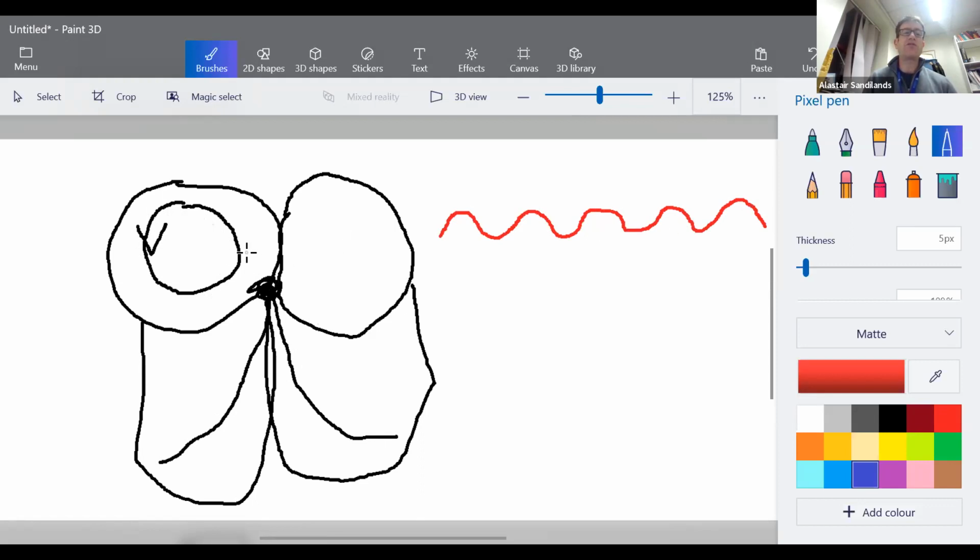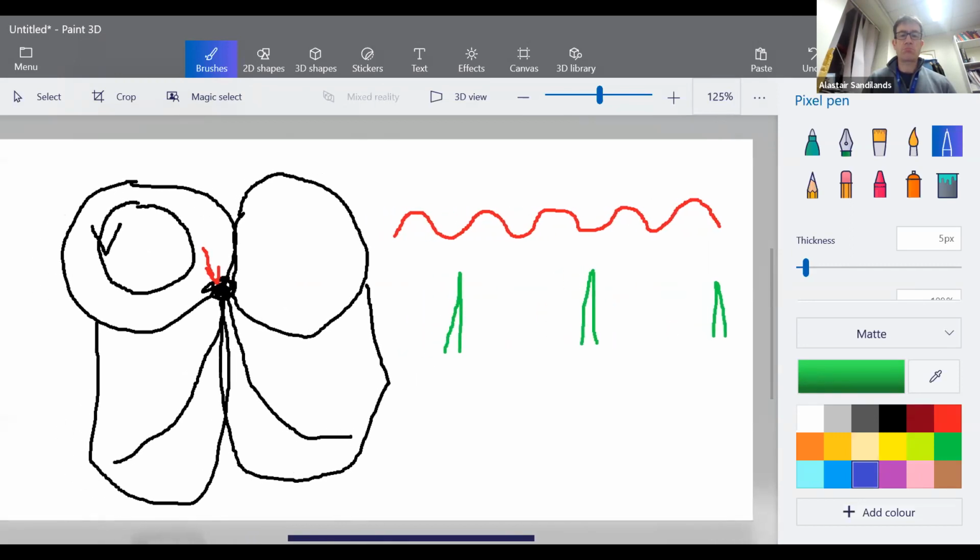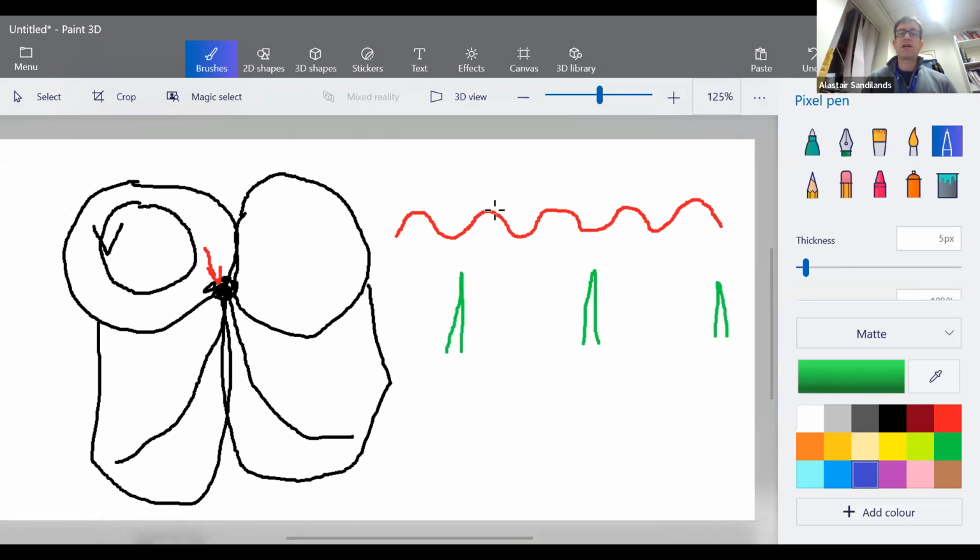Now, if we superimpose the flutter going down into the AV node, down the bundles, we can superimpose a different color, so that we can say this is our QRS signal. I'm going to put the QRS signal roughly every 2 beats. Basically, the flutter travels around at 300 beats a minute. So every flutter wave is 300 beats a minute, and so we superimpose that.